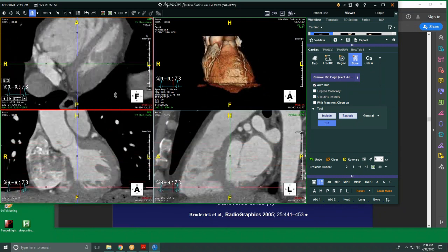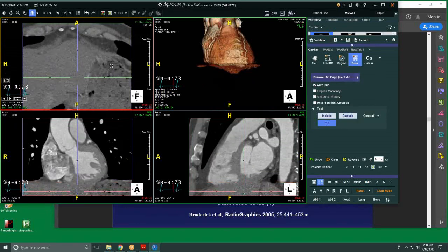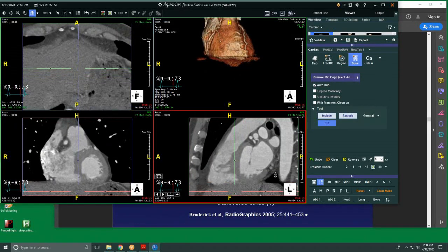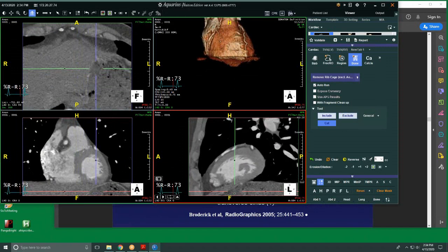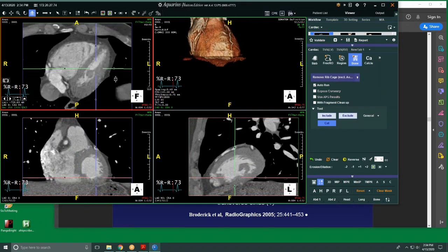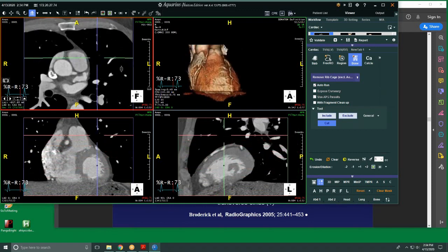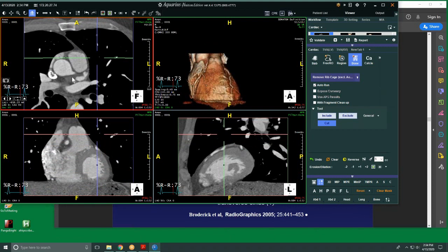See right over here, zoom out a little bit, zoomed in a little too much. You see right over, this guy doesn't have a lot of pericardial fluid. You don't see it very well here. See right over there, you see a little bit of a line. That's the normal pericardial sac. And right in there, that's the pericardial sac.